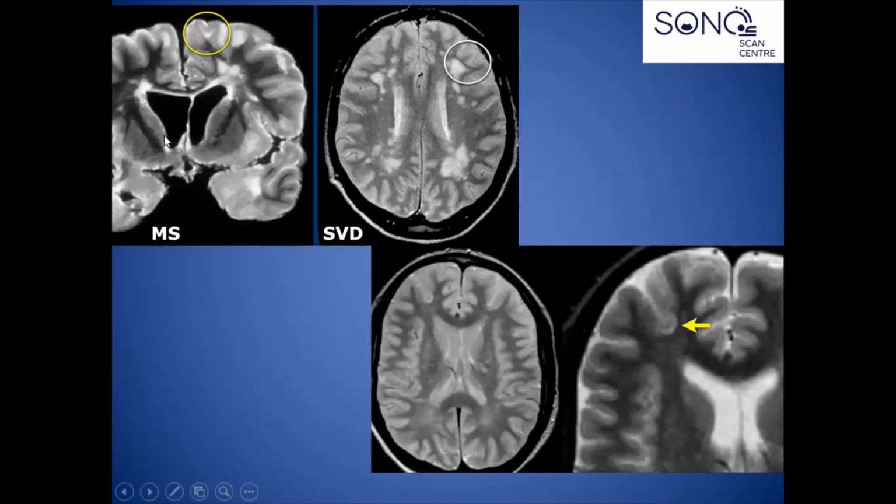One of the closer differential diagnoses for multiple sclerosis is in older patients who don't have this clinical history and just walk in. We commonly find this above the age of 50 years, with hypertension, hypercholesterolemia or diabetes: small vessel ischemic changes. It's a usual finding. So how to differentiate from this?